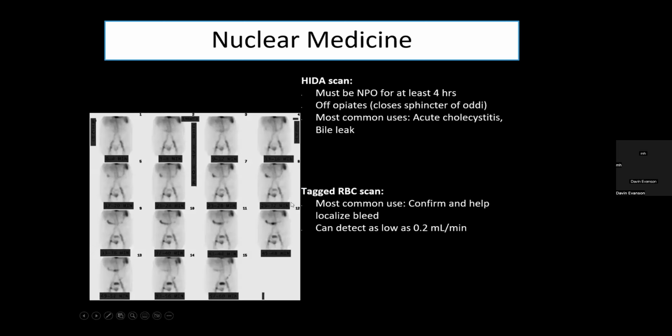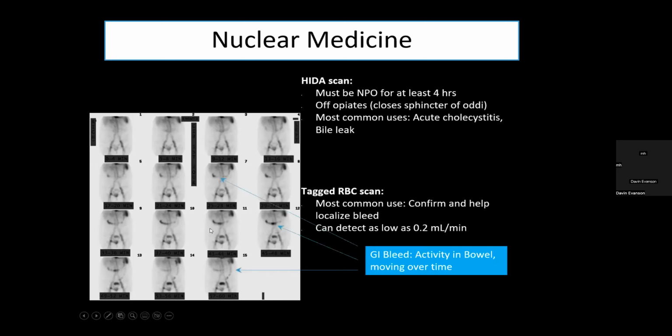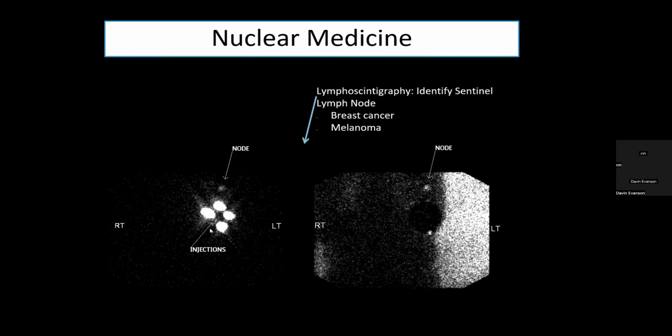Now, for a patient with GI bleeding, you'll see a lot of this as future surgical interns. Several options. You can do a CT angio study, which may or may not show the bleed, and you can do a nuclear medicine test where you tag the patient's own red blood cells with technetium, re-inject them into the patient, and you're looking for where the blood is pooling, here in the transverse colon, it looks like. And that tells the surgeon where to look. A lot of times, there'll be radiology doing embolization of that area once you confirm the bleed.